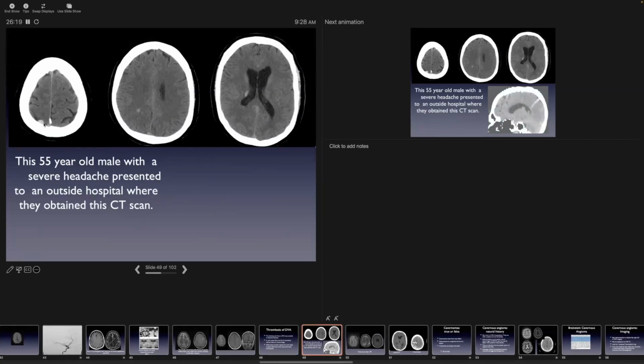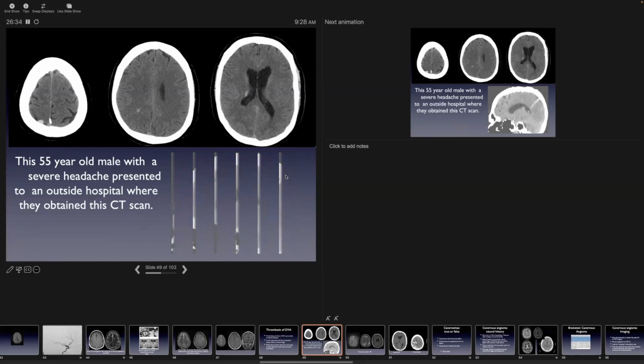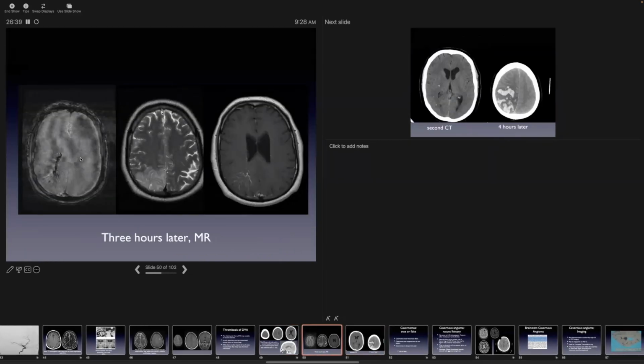So this patient was transferred from an outside hospital. You can see this high attenuation structure here. If you follow it down lower here, you see it here, you see it here. This is the reconstruction. Notice it's of high attenuation. The patient went on and had this MR scan at our hospital. Again, you see the signal dropout in the draining vein. You see this cortical thickening and abnormal T2 relaxation time, and you see the enhancement of the caput.